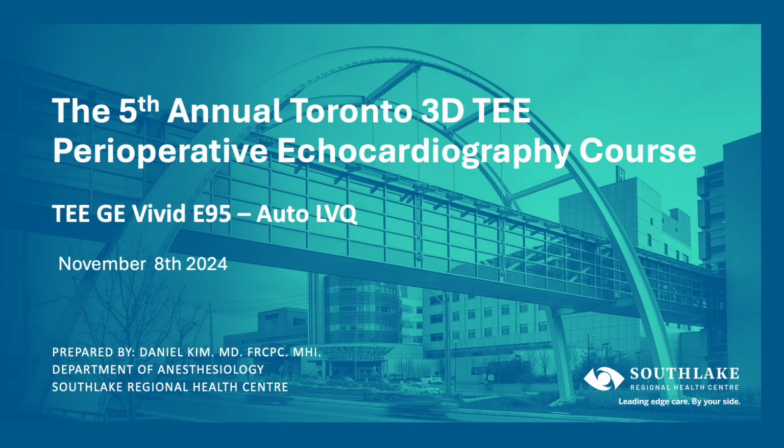Hello, this is the 5th annual Toronto 3D TEE perioperative echocardiography course. This particular video is on auto LVQ using the GE Vivid E95 platform from a TEE perspective.